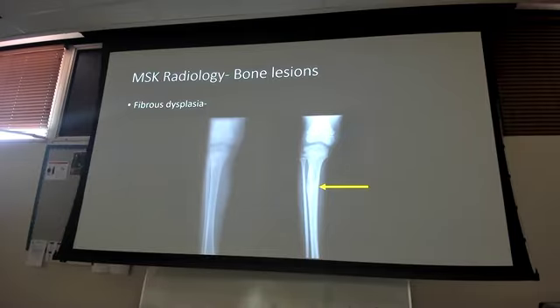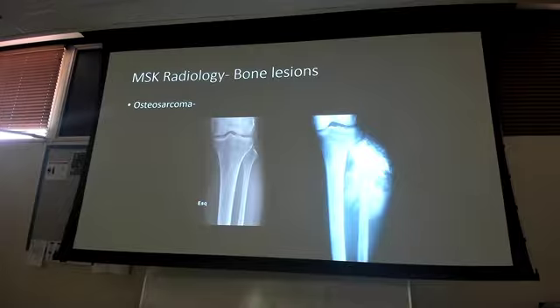Fibrous dysplasia. It's the fibrous area of the tissue on the tibia, again, typically in pediatrics. So everything in bone lesions, even though it's not on each particular slide, is FYI. I'm not testing you on bone lesions. Say it again. Then you get into the scary crap. May not know what it is, but your pucker factor should go up, and you're going to be calling RADs and probably oncology right afterwards, because that's an osteosarcoma. That is not a good thing. Complete destruction of the cortex of the affected bone.